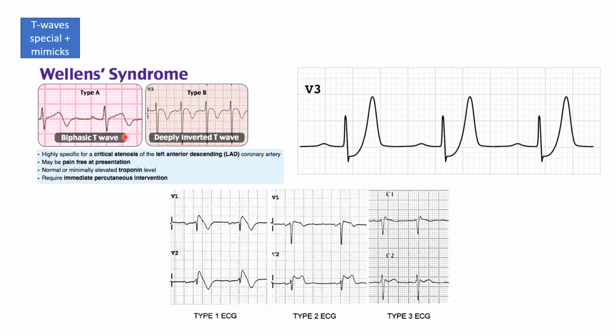Then you have other T wave syndromes. They're not necessarily T wave problems, but somewhere the T wave looks a bit funky. And this over here is very infamous. It's called the De Winter syndrome. You see here that you have an ST depression in the precordials, usually V1, V2, V3, I think, and then it goes from this ST depression up into a peaked T wave and then down again. This is like a widowmaker kind of, I think it's an LAD. It's a high mortality ECG, so it's an OMI.